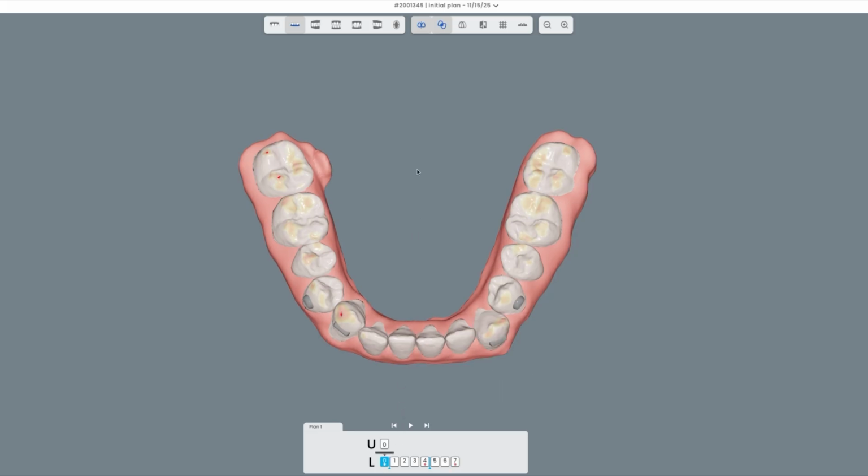So as we go through the sequence, typically it's the same thing. I follow through to see if there's any interferences or concerns. Now, as we notice from the beginning, this is about 7 trays, 7 aligners in there. Looks like we're accomplishing pretty good with this for the most part. Things that I look for, because our focus is this mandibular anterior area, are the attachments with this, the amount of movement that we're moving in here. Now, if you notice, there are a couple of areas a little bit of a concern in there.